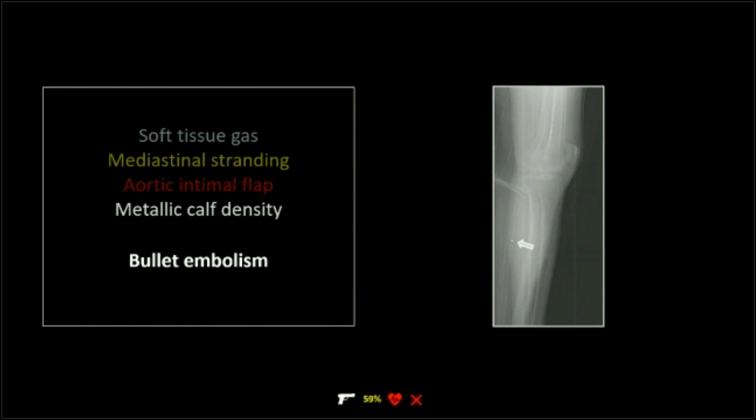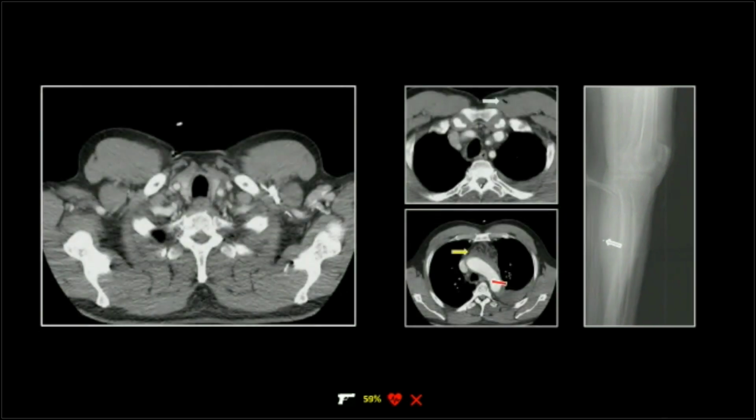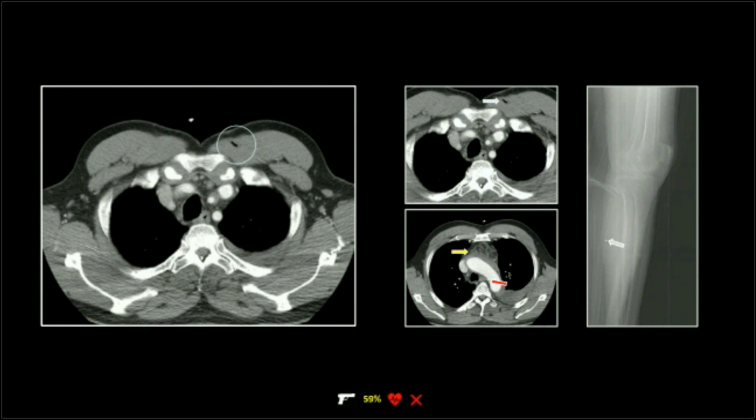And I called it in and said, you know, I agree, this is a BB embolism. How did your tech know? And they said, there was a foreign body implied by the history, and it's our standard to do a full body lateral scout in that case. So it actually wasn't the genius of the tech. But they did adhere to an intelligent protocol, that's for sure.